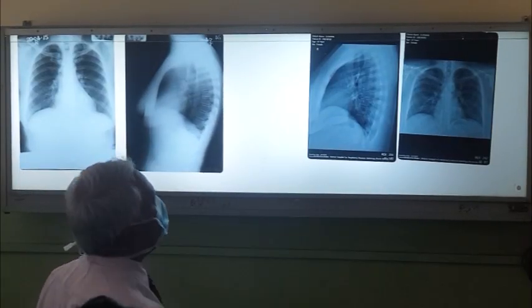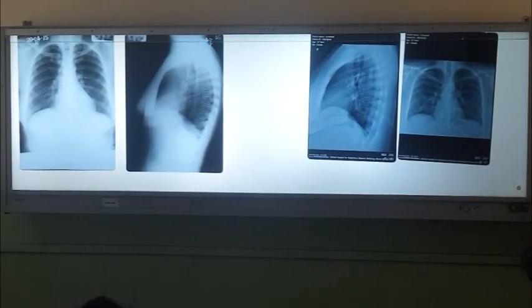Right, these are normal looking X-rays. Although we call them X-rays, these are radiographs. X-ray means X-ray beam, and so we normally say chest X-ray. All doctors should be able to read chest X-rays, because in the OPD, when you post as an intern, you are supposed to sign for medicals. At least you should be able to say whether it is normal or abnormal. So any doctor should be able to read chest X-rays.